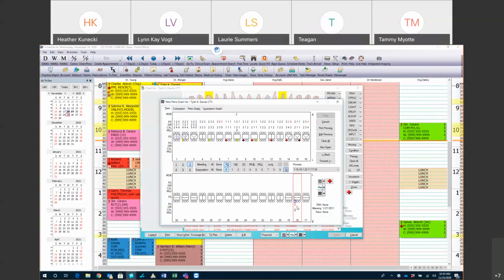If I needed an 11, I could just click the 1 after I hit the 10, and it's going to give me a 1 with an underline on it, and it's going to be red. So now I know it's an 11. If it was a 12, I could hit 10, and then the 2, and then it puts the underline. So you can see right here, the 2, that's a healthy 2 pocket number versus the 12 is going to be red with a 2 with an underline on it. So that's how you chart anything over a 10.